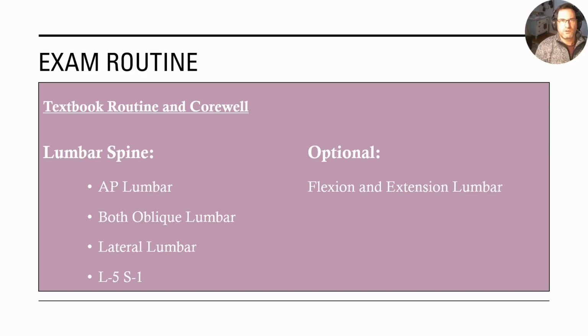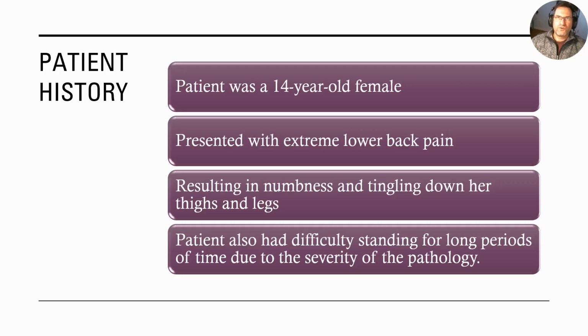The exam for a lumbar spine is the AP lumbar, both obliques of the lumbar, lateral lumbar, and L5S1, and a flexion and extension projection is optional. The patient was a 14-year-old patient that presented with extreme lower back pain, resulting in numbness and tingling down her thighs and legs. The patient also had difficulty standing for long periods of time due to the severity.